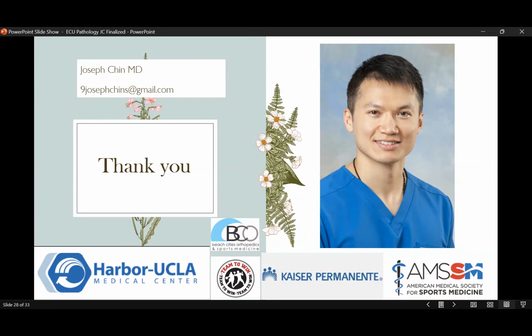And then the last thing I'll say is on the Guyon's Canal image you had mentioned that the palmaris brevis forms the roof. On that image you had, it's hard with one static image. I would argue that was perhaps an accessory abductor digiti minimi muscle. Usually the palmaris brevis is a bit flatter, and when you're looking at a muscle that runs obliquely across, from the distal forearm fascia across Guyon's Canal and then to the hypothenar hand, that's oftentimes an accessory ADM. So just being aware of that anatomic variation as well.